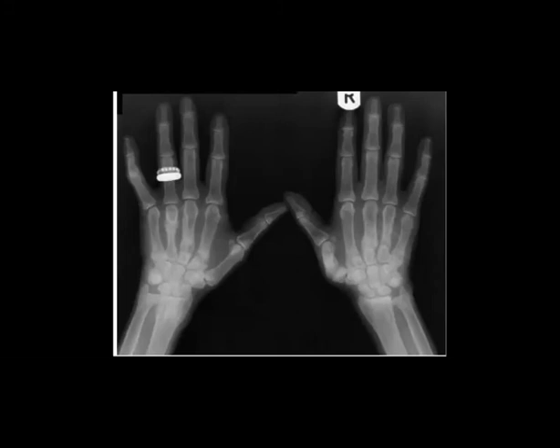So imagine, yeah, good start, Sarah, that there are lines that look like fractures, and these fractures are bilateral and rather symmetrical, right? These fractures include the metacarpals, right? Nice. There is maybe some generalized osteopenia as well, right? So fractures, Marwa, perfect. Transverse lucencies.